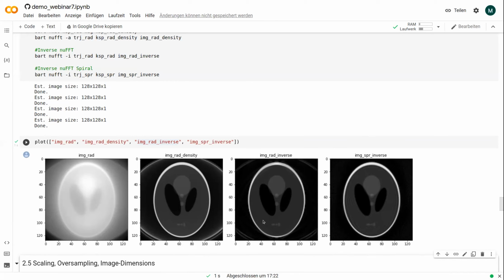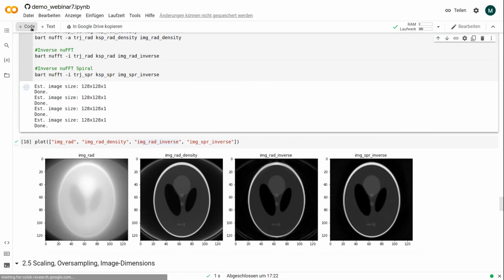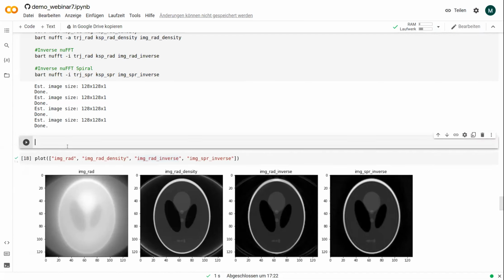I don't have any success with inverse NUFFT. With 3D or with 2D data? It's 3D. With 3D, yeah, I don't have much luck with the inverse mode. But when I weight with the adjoint before, on the k-space data itself, then it was much better with the NUFFT option. Yeah, I will talk about that shortly.